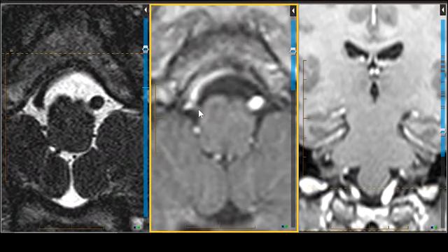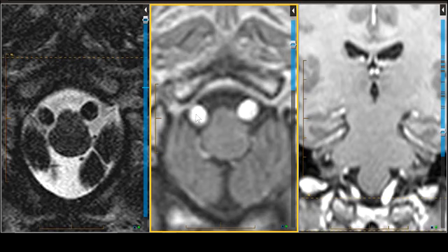Then as we scroll down, we lose the nerve for a little bit, kind of gets buried and hidden by the pulsation phenomena and anatomy of the vertebral artery, but there is our hypoglossal canal with an anterolateral course. We said there are multiple rootlets that converge into one nerve, sometimes two nerves traveling together, but no more than two trunks is what you see with the hypoglossal nerve.